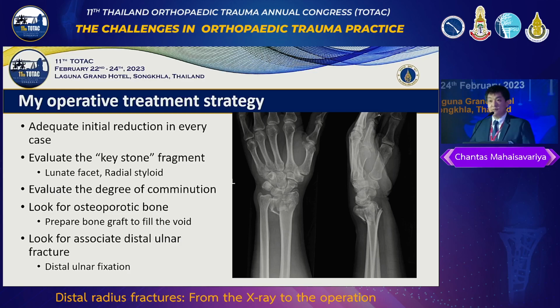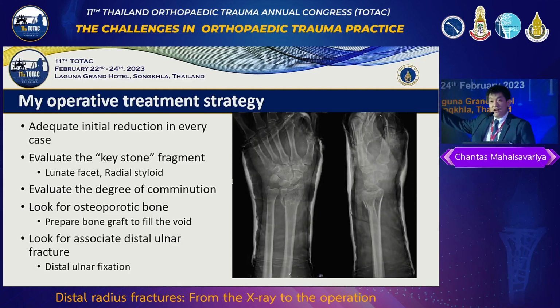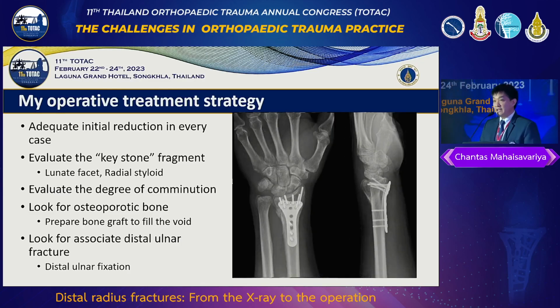So in the audience, please raise your hand if you think this case is complicated. Please raise your hand if you think it's easier. And this is the final X-ray after union.